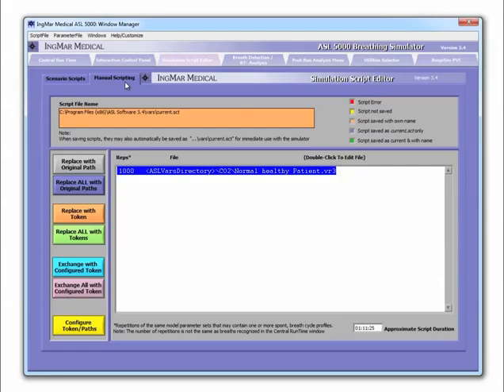And if you remember, you saw these in the interactive panel. What these do is these represent a specific state and a specific lung model. These files can be thought of as the ingredients to a full recipe.